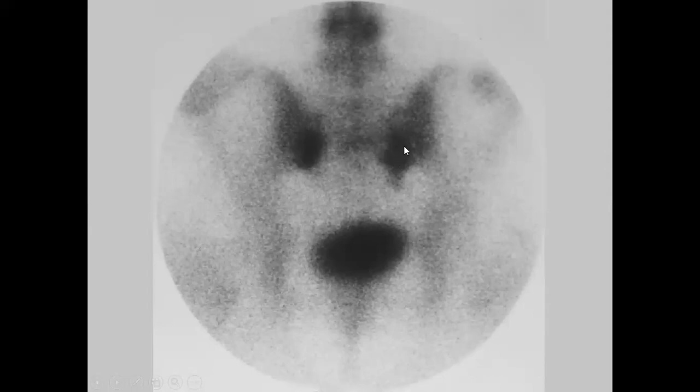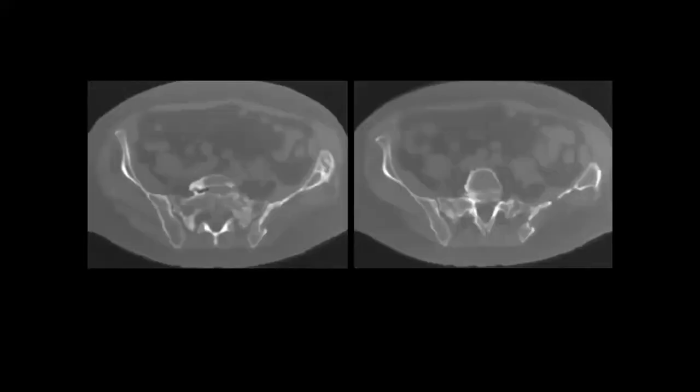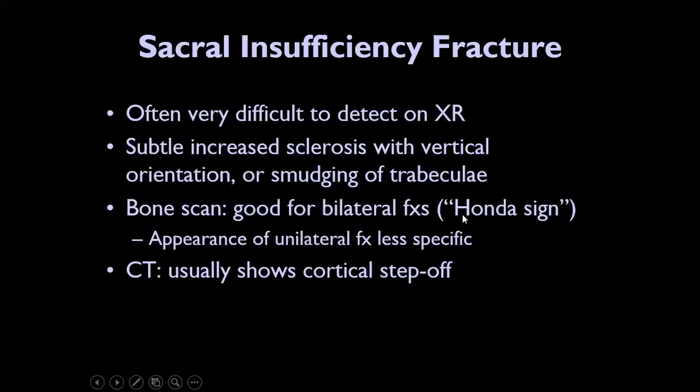This is very important. They like it in the exam as one of the common places for stress or insufficiency fractures. You can see here, when the patient did CT, that he already has this appearance. Yes, so you can see the fractures here easily. Even you can see these fractures, right? So this is what is called sacral insufficiency fracture.